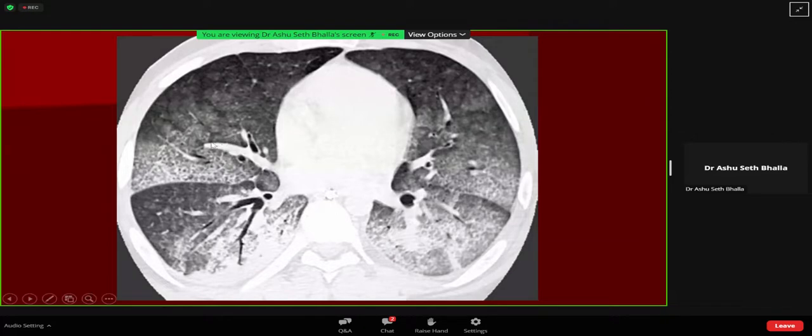So the other important sign, you can see in the same patient, there are different ages of the DAH. This lobular appearance is like an inverse photocopy of, like we say, thickening of the interlobular septum in IPF or in fluid overload. Here the reverse happens, which means that while the rest of the lung is looking gray, the interlobular septum, this polygonal structure, is looking black, which means that this is normal while this has hemorrhage in it. And why does this appear black?